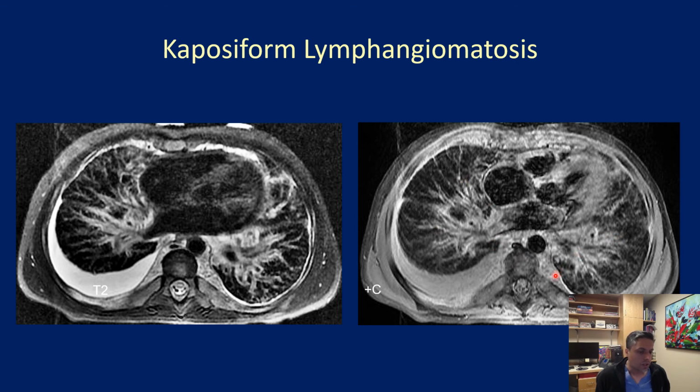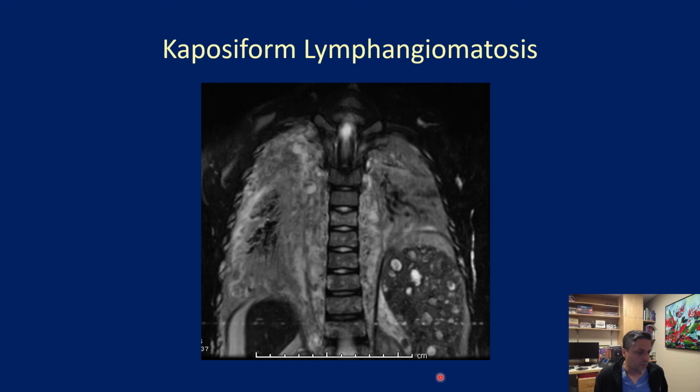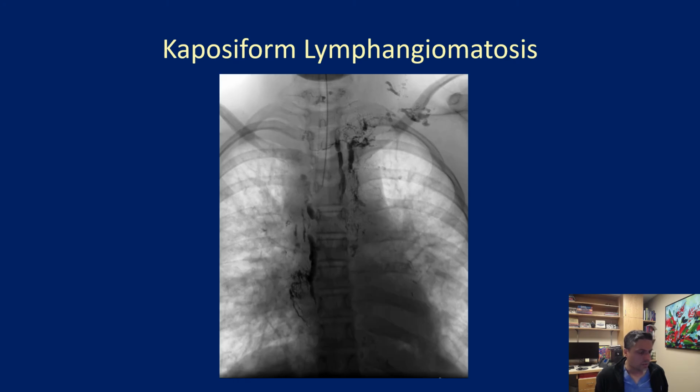Note is also made of soft tissue disease in the perivascular region, in the posterior mediastinum, and in the retrocrural region. On HRCT of the chest, these findings are seen as interlobular and intralobular septal thickening. Solid organ involvement can also be seen, as in infiltration of the spleen in this patient. Note is also made of heterogeneity of the marrow signal in the spine of this patient. The imaging findings are very similar to CCLA, with evidence of stasis of contrast and reflux.